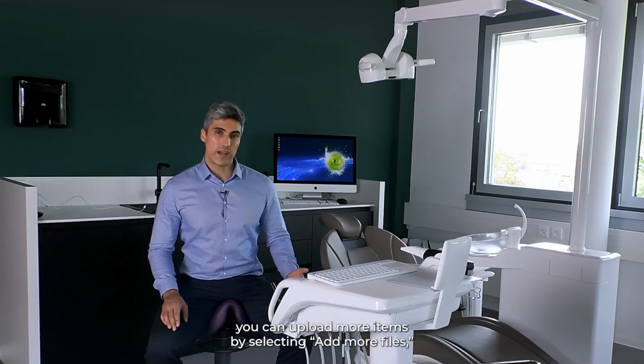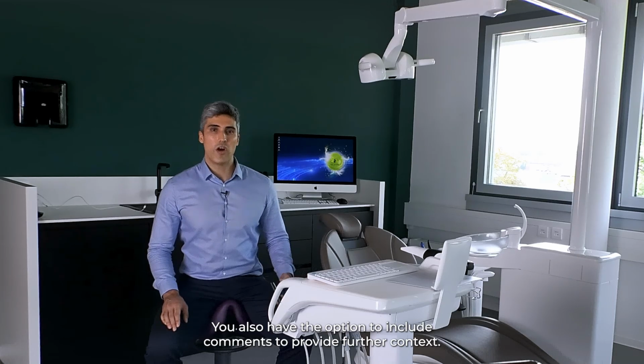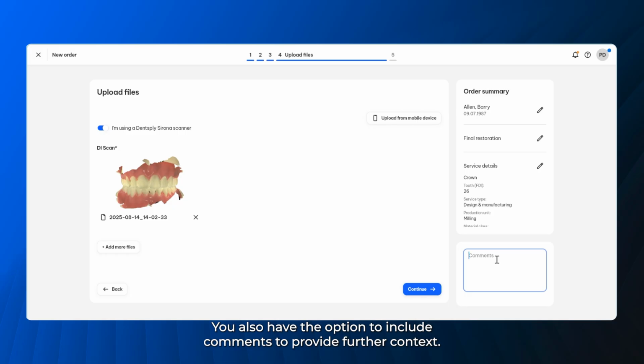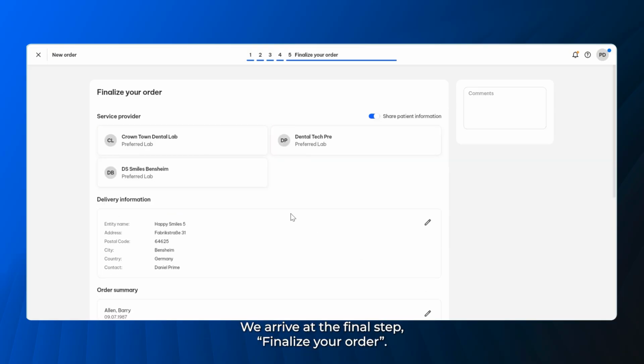If you need, you can upload more items by selecting Add More Files, or use your mobile phone or tablet by clicking Upload from Mobile Device and scanning the QR code. You also have the option to include comments to provide further context. Click on Continue. We arrive at the final step, finalize your order.